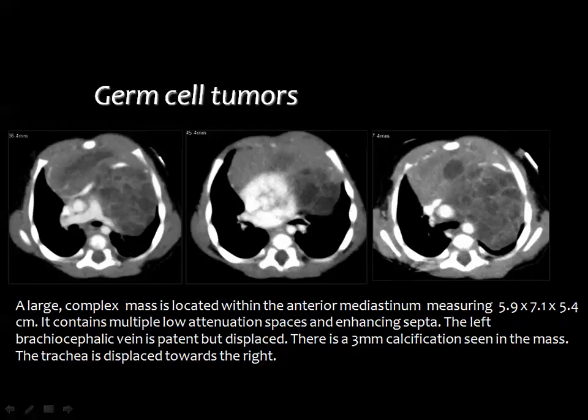And also here you see a big anterior mediastinal mass. These hypodensities are related to the fat content of the lesion, and these hyperdensities are vessels in the mediastinum, but you cannot see actually the presence of fat.